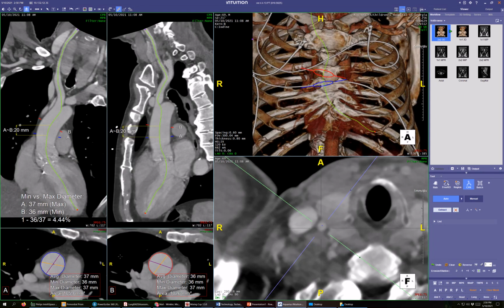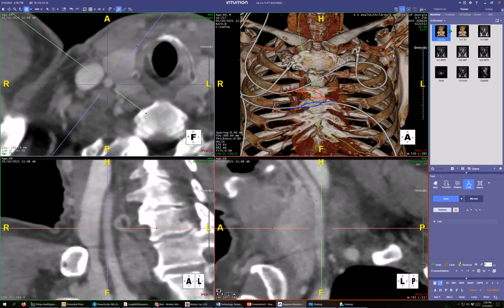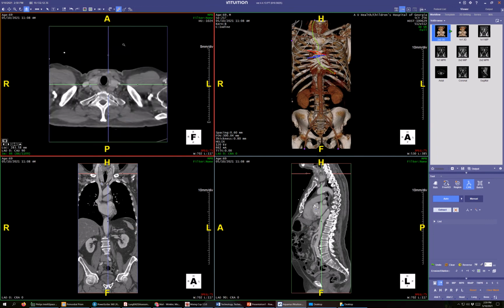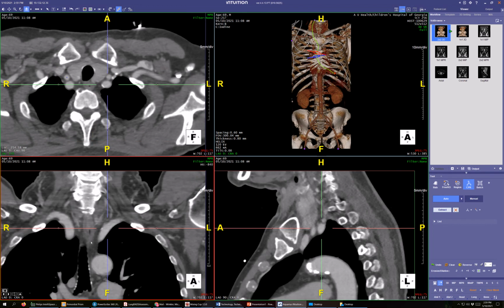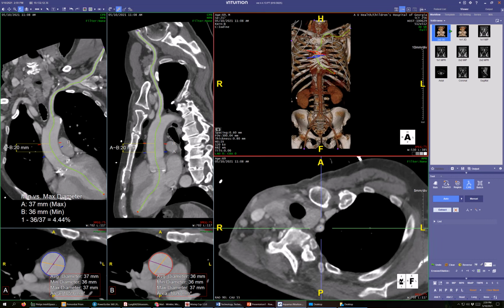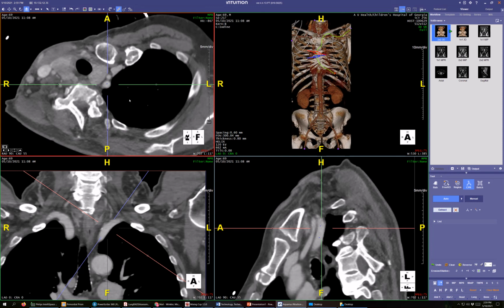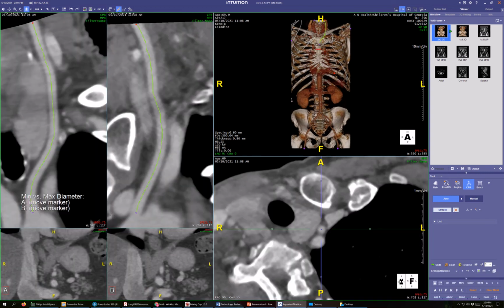Clicking on the right carotid. That worked as well. Yeah, it's going better this time, which is what one would expect. Hit reset. Up we go. Here's the subclavian. That worked. And that worked. So it all worked this time. Now we'll hit extract.